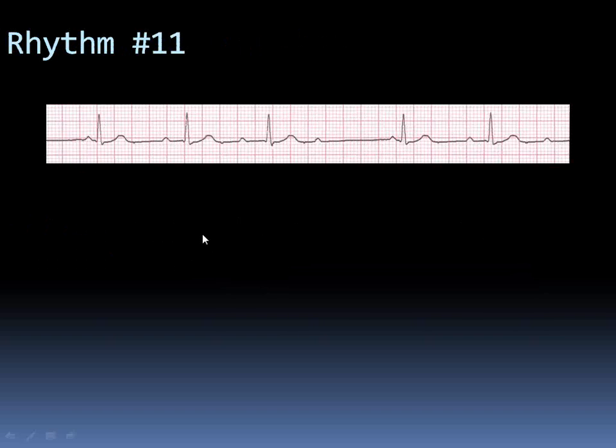Now, what do you think is going on over here? The patient has dropped one QRS. Good. So this patient is having progressively increasing PR intervals, as Fatma pointed out clearly. This is the first PR interval, which appears to be normal. This is the second PR interval, which lengthens.